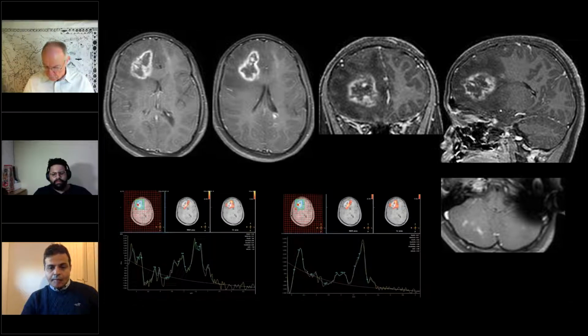The cerebellar lesions seem to be distant anatomically. So any infiltrative disorders radiologically? You mean something like lymphoma and leukemia, things like that? Yeah, histiocytosis. Which of those would calcify, unless we're dealing with two pathologies?